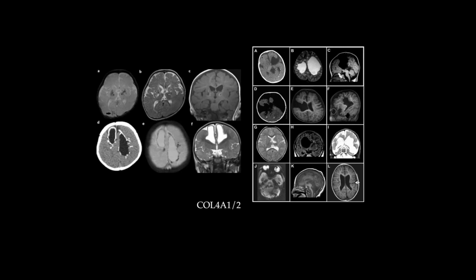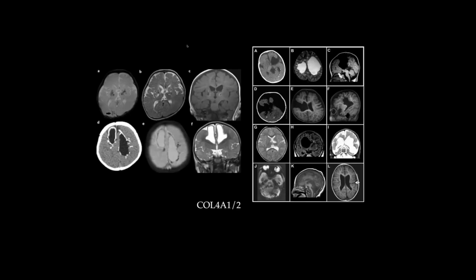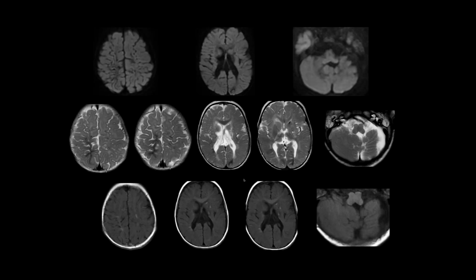So it's a double trouble lesion. I was asking whether this child has calcifications. I'm not sure. This can be hemosiderin or calcification. This is a GRE, so maybe a CT would be helpful. I'll do a CT when they come back. Okay.